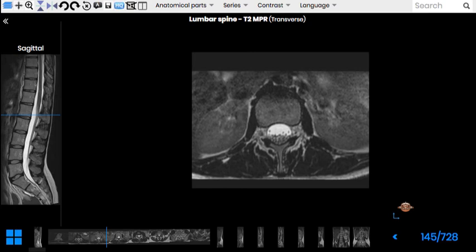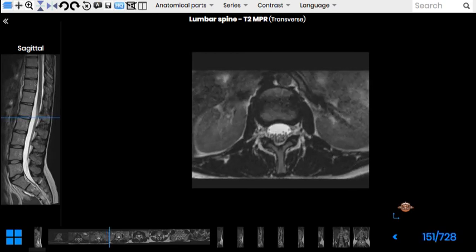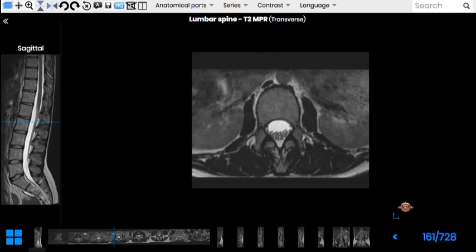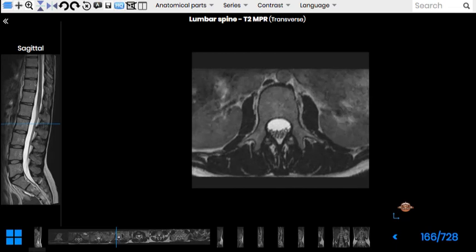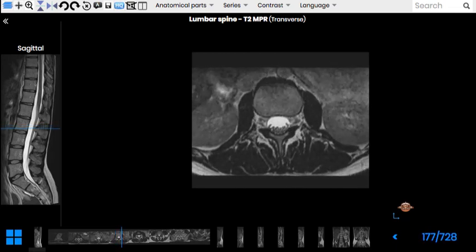And the next nerve, which is the closest one inside of the vertebral canal, is the traversing nerve L2, and it's going to leave the canal at the next intervertebral foramen right here. So one by one, these nerves leave. This is the L2 spinal nerve right here.